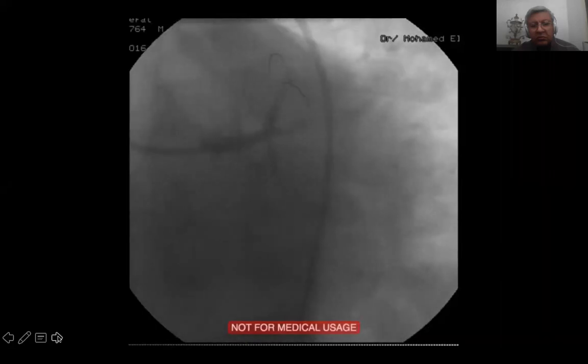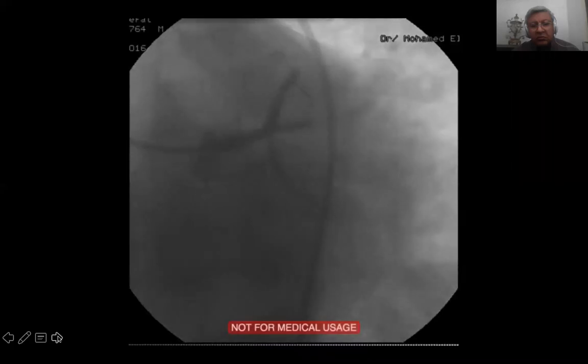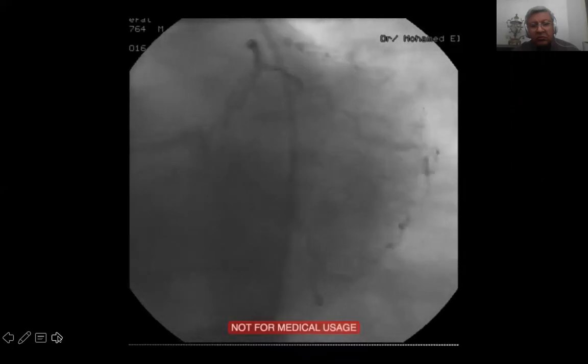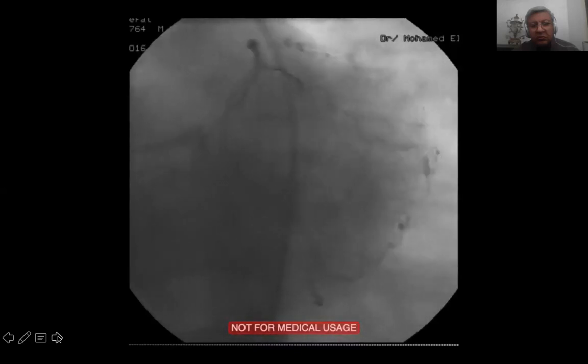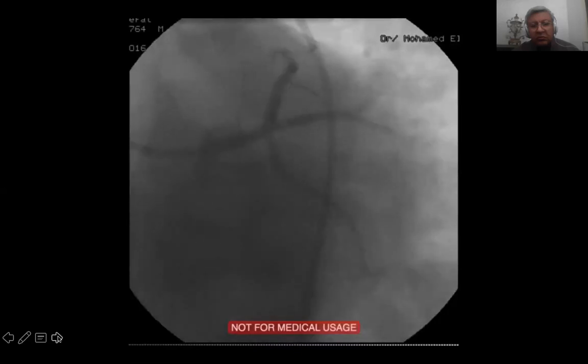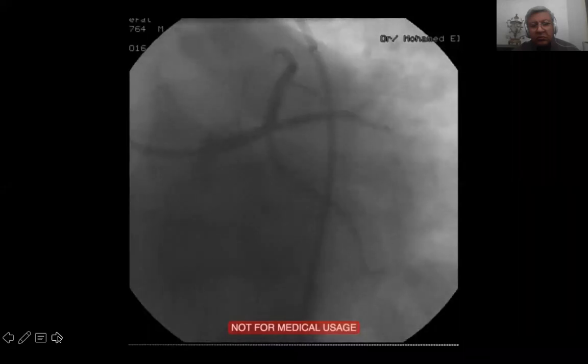You know, Dr. Ahmed, most of the time, if you have some pinching, especially with the stents in the left main, if you do fractional flow reserve, FFR, you will see it is not that reduced, not much, and most of the time you see it very well.